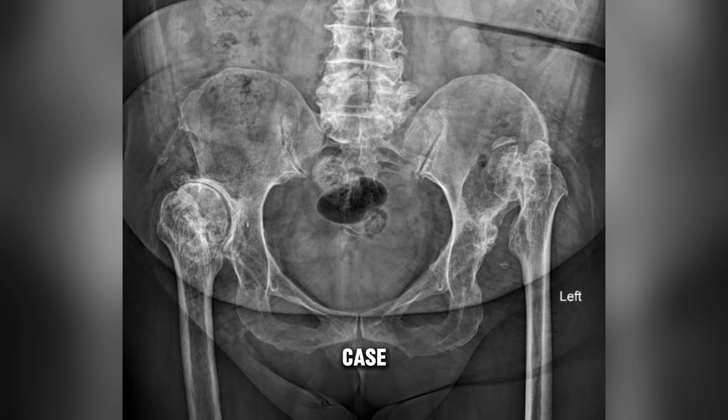Here is an untreated case of bilateral developmental dysplasia of the hip. The acetabula are severely hypoplastic on both sides, with superior displacement and pseudo-articulation of the femoral heads with the iliac bones, as well as deformity and advanced degenerative changes, which are more pronounced on the left side.